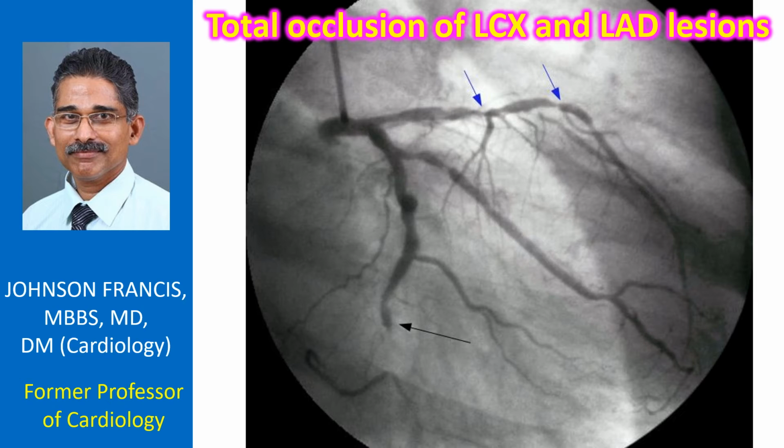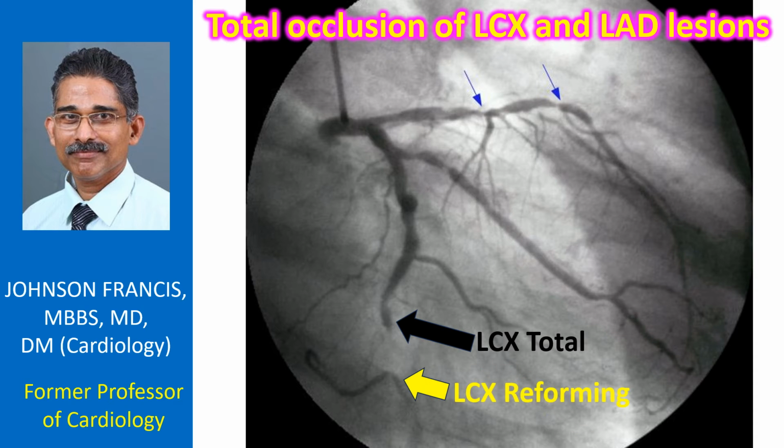The still picture from left coronary angiogram shows total occlusion of distal left circumflex coronary artery with absent dye filling in a short segment. Multiple significant lesions are seen in left anterior descending coronary artery. Significant lesions are also seen in the obtuse marginal branch of the left circumflex coronary artery.